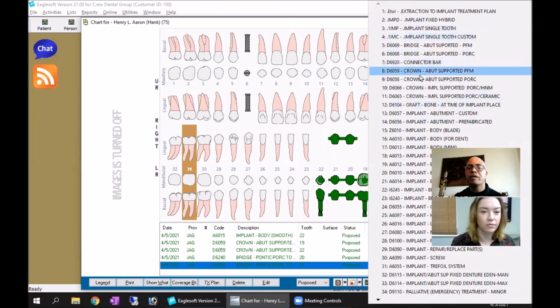Yeah, and you can see I actually have a lot of these extras. Like I have this implant bridge pontics and implant bridge PFMs, just because I wanted to have a special drawing for these things so that they looked a little differently. But again, you don't need to do all that as long as you have what you're looking for.